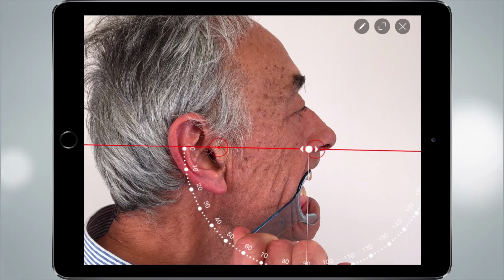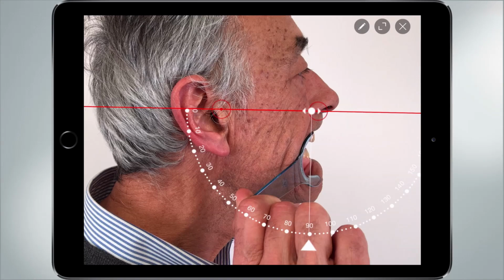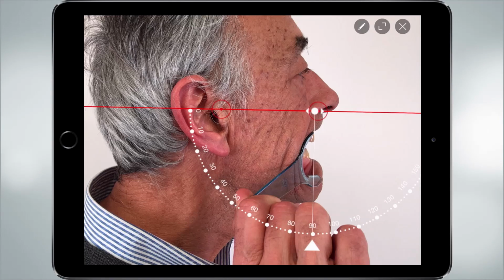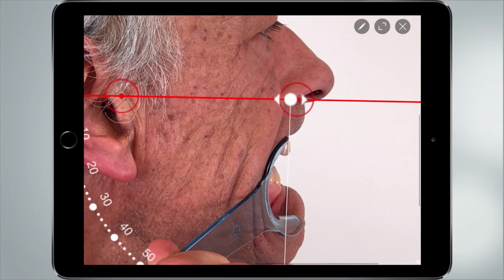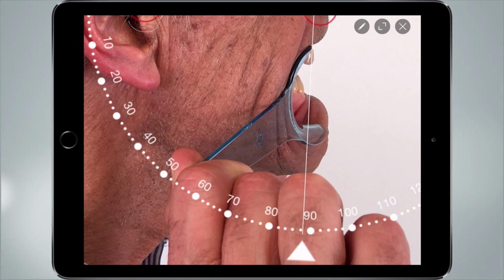And we see now the situation here, the right central incisor long axis seems to be a little bit more in. You see here, can enlarge even more. You see the tiny bit, central incisor right side is like that. Okay, it's less than 90 degrees.